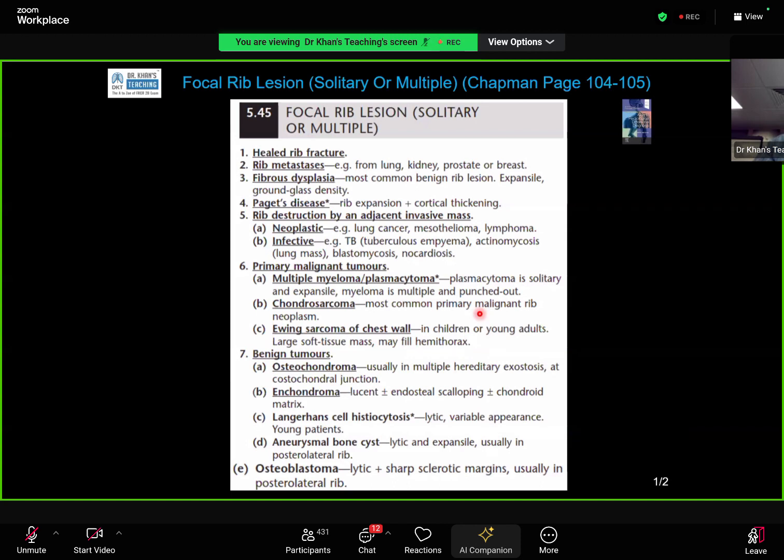In any bone, particularly in this age group, infection and Ewing's, blindly you should talk about them together. On a plain film, you cannot commit how much is the soft tissue component. So aggressive lesions, infection and Ewing's, go together. Even clinically, Ewing's can present with infection-like symptoms, raised ESR, fever, etc. So in this case, the differential diagnosis is the key thing.